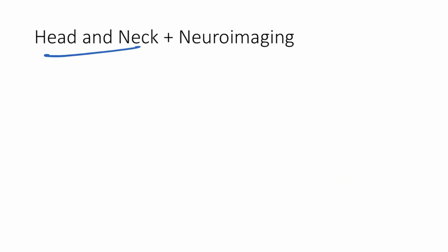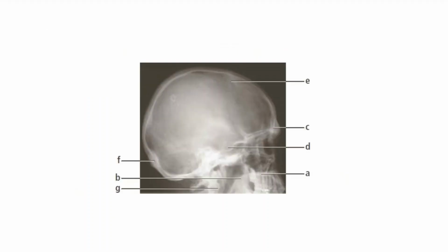Now let us see about radiology of head and neck and neuroradiology. Let us mark the structures in this skull X-ray.